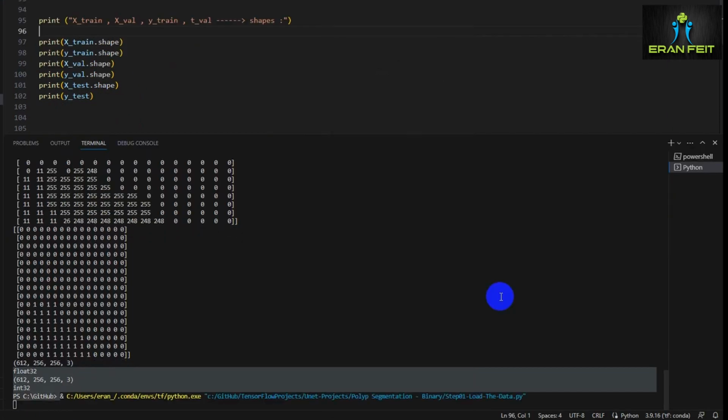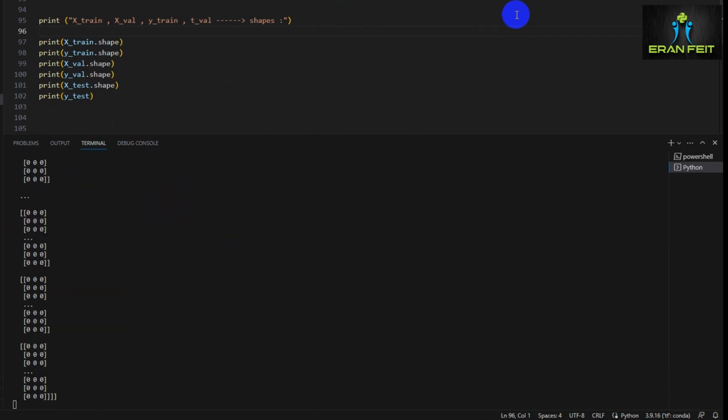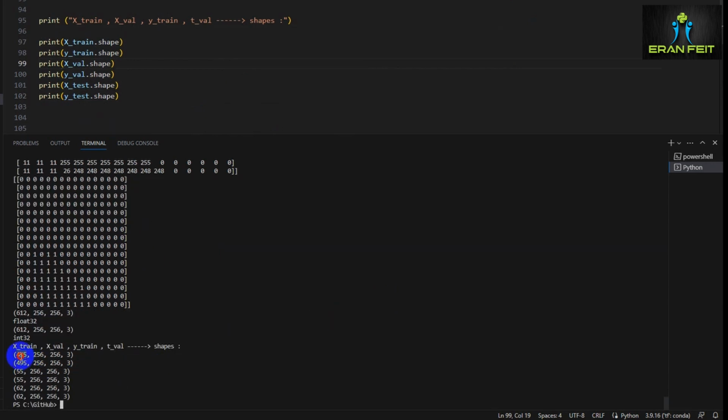Let's run it. Okay, let's run it again after we fix this. Very nice. Okay, we've successfully preprocessed our data and split it into our necessary datasets.